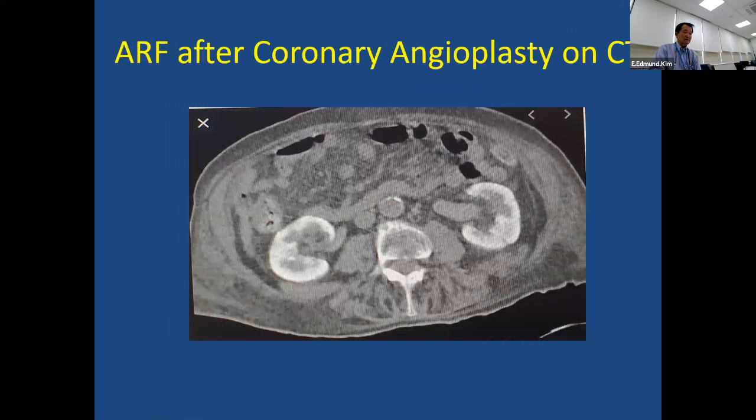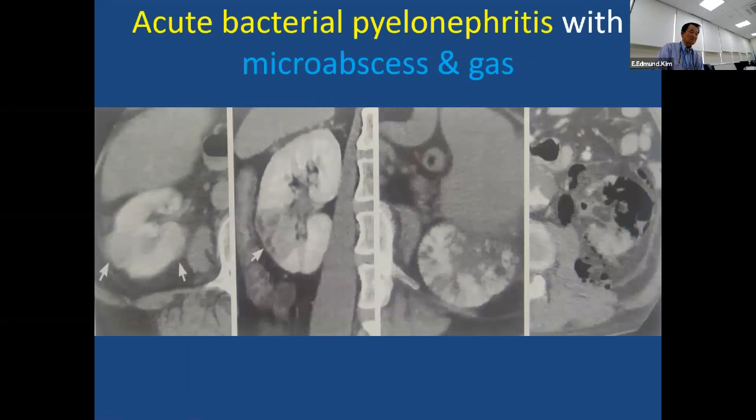And then, after a coronary angiogram, the one day earlier still shows contrast retained in the cortex. It doesn't drain. This proximal ureter, it should drain. So there is some tubular secretory problem you can suspect.